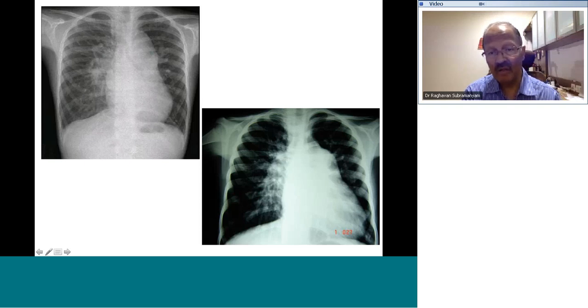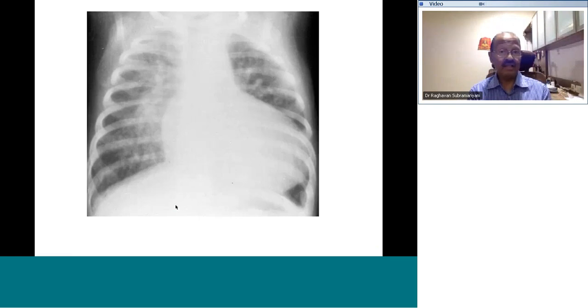The same thing is found in another patient here, a very large plethora, must be a child with a very large aortopulmonary shunt. Pulmonary artery is big, aorta is also big, and a severe plethora. A very large size PDA or an AP window could contribute to such an X-ray. Therefore, a dilated aorta with PA and plethoric lung, think of a patent ductus arteriosus or any aortopulmonary shunt.